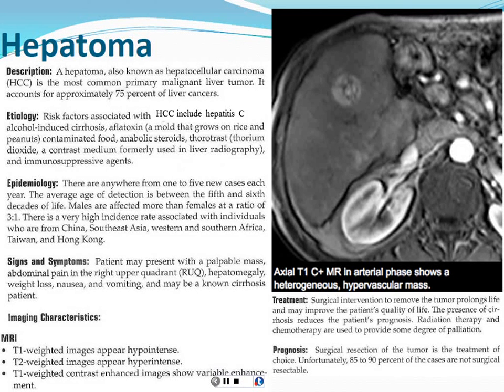This is one of those lesions that shows up hypervascular on imaging. So this is a post-contrast MRI, and whereas typical colon cancer metastasis or pancreatic cancer metastasis will enhance less than the background liver, these actually enhance more on the early arterial phase. You can see that most of the contrast is here in the aorta, so you're in an early arterial phase. And because it's so hypervascular, the contrast gets there quickly and it washes out quickly. So we compare the early images to the late images. On the later images, you'll see that the contrast has washed out, and that's very suspicious for hepatocellular carcinoma.